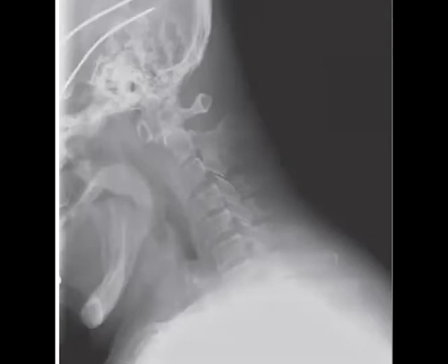They mentioned that in the pediatric age group, sometimes you can find a false widening. Up to how many millimeters is accepted in the pediatric age group? 5 millimeters, perfect. So up to 5 millimeters in the pediatric age group is accepted to see this widening. Okay?